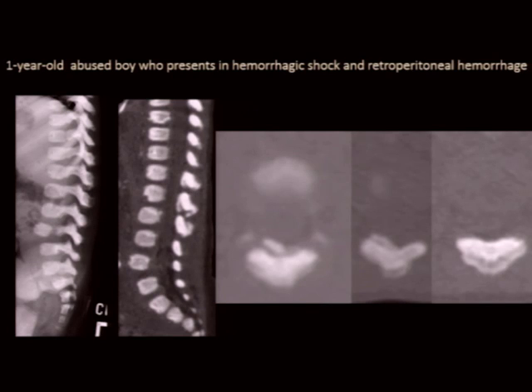In addition, if you look at the remainder of the spine, you can see additional vertebral bodies showing notching and that fish mouth deformity, indicating additional areas of compression fracture of the spine.